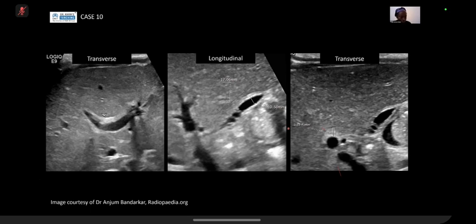If it's less than 2 centimeters in length, then that suggests that your gallbladder is small. And this has to be on a well-fasted child. And if you see any irregularity of the gallbladder as well, then that suggests that your gallbladder is abnormal, which ties in with the diagnosis of biliary atresia. And then this picture just shows you the triangular cord sign on a transverse image, but I normally measure it on another transverse image, which is where I normally measure it.